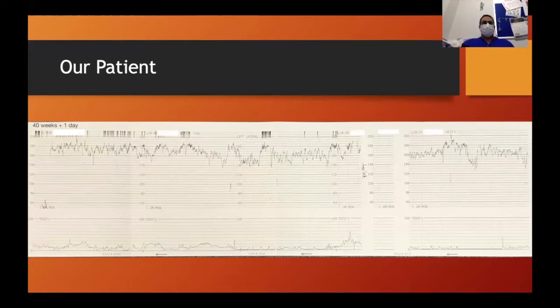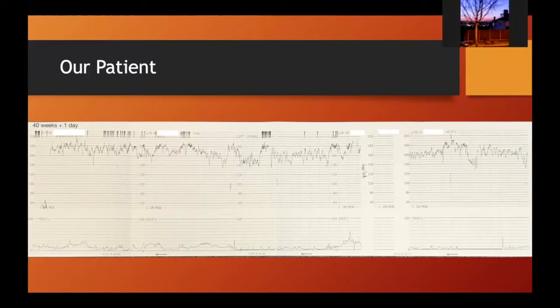Now, am I expecting contractions? She has been contracting, so potential contractions. Am I expecting normal variability? Yes. Everybody's supposed to have normal variability. Am I expecting accelerations? Maybe. If she has contractions, then potentially yes.